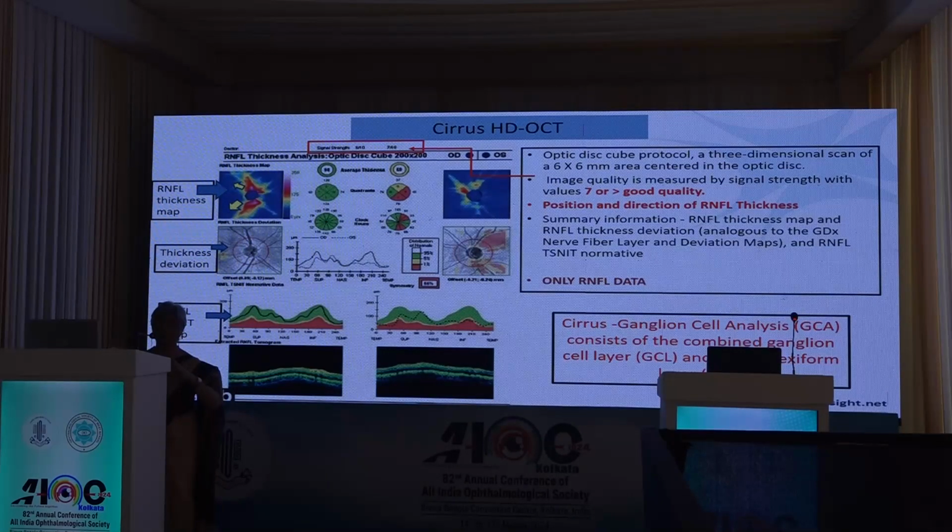Remember, at the top and the bottom of the optic nerve, they are in 2 forms, so in 2 big radiations. Now, if you compare the right eye with the left eye, you find that obviously there's lots more blue, lots more sky, lots more ocean. Therefore, that means that these nerve fibers have died. This gives you an immense amount of information about how the nerve is.